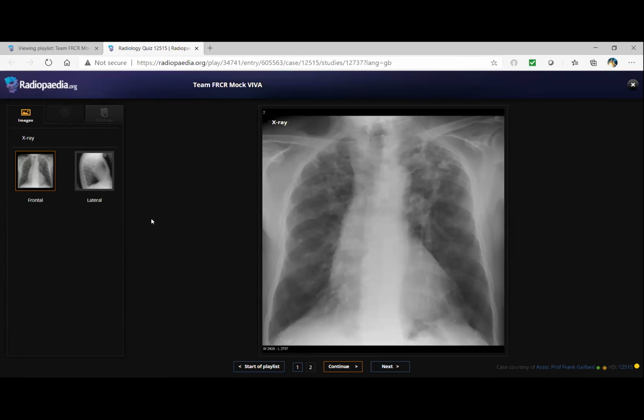This is a frontal chest radiograph of an adult patient. I can see bilateral abnormalities involving the upper and mid zones, predominantly in the left upper zone, where I can see multiple areas of fibrosis, volume loss, elevation of the bilateral hila, and some tenting of the diaphragm also. The cardiomediastinal contour appears normal. I can see some right paratracheal opacity also, but it can be due to projection.